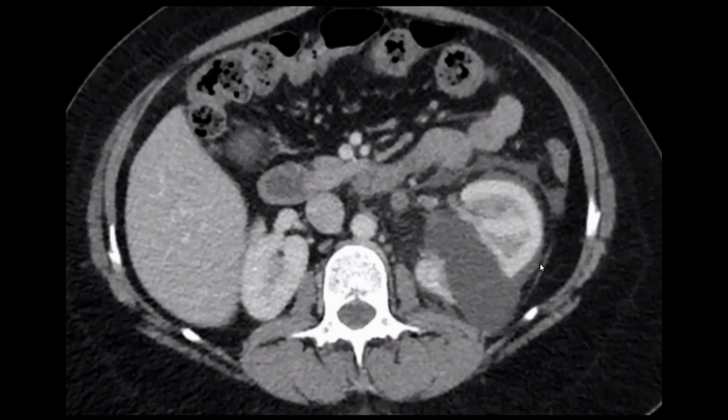But if it is not enhancing, as in this case, there are different causes like hypercoagulability status, pregnancy, dehydration, and some syndromes. This one is considered a bland thrombus, not malignant thrombus, and in this case we have a breast cancer case.